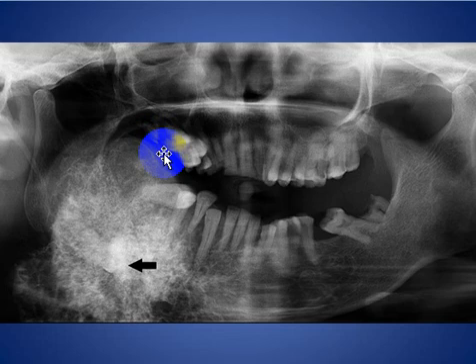Here, a patient with calcifying epithelial odontogenic tumor. This is the panorama view, and we see here a mixed radiolucent lesion involving the right mandible and displacement of the mandibular and maxillary teeth, giving the appearance of a driven snow sign.